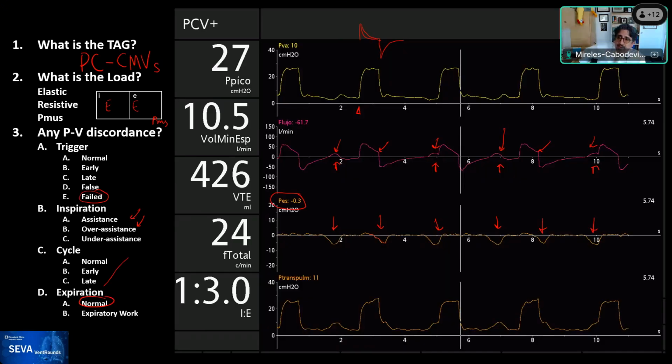My volume is a little bit low, so I'm going to rephrase what you said. So if I make an error, please tell me. But what you're saying is that if this had been using a different type of trigger, for example, the IntelliSync, which uses an algorithm to optimize the sensitivity and minimize these failed triggers, that this could have been a solution for this circumstance. Albeit, and you have commented this before, Ariel, that it also may lead to false triggers when there's cardiac oscillations playing along. Am I reading you correctly?